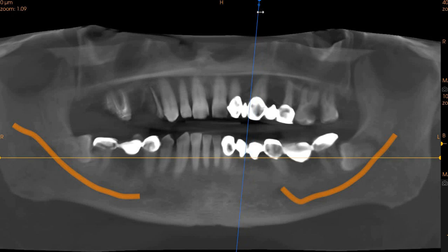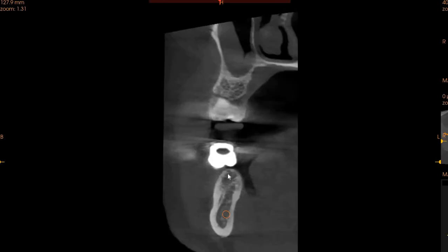The lower left, as you can very clearly see, we've got multiple missing teeth in the anterior region of the bridge, and then we've got a 6 missing, which is distal to the pier abutment. Here we have approximately 6 millimeters of width with 12 millimeters of height.